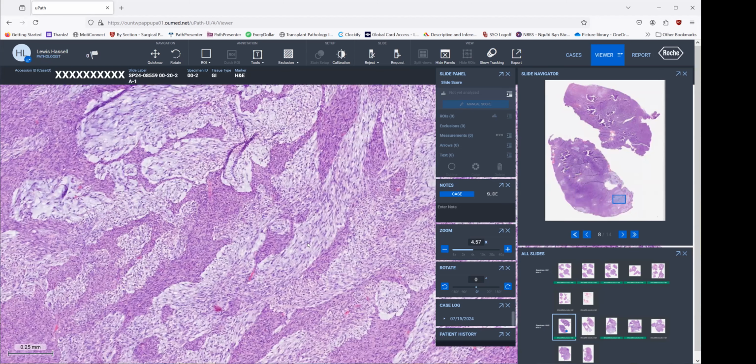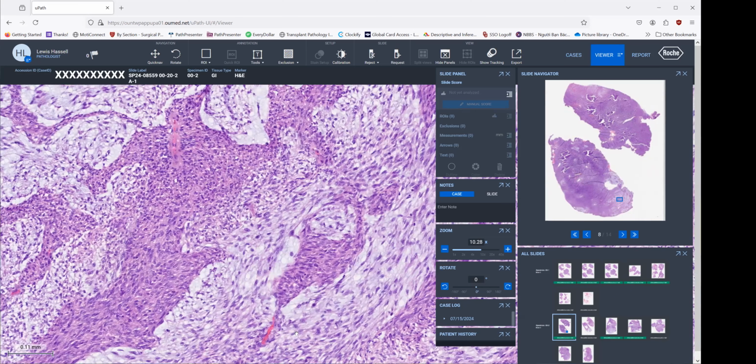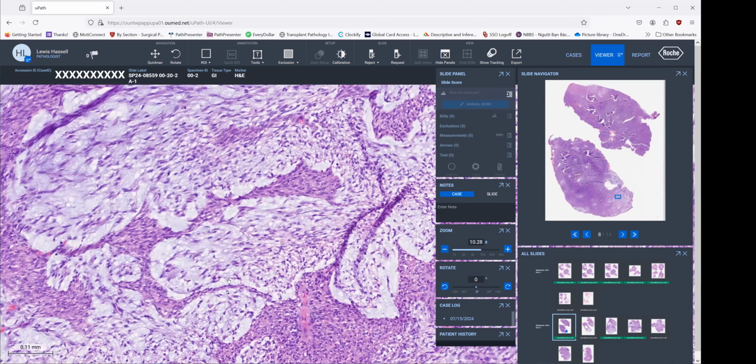If we got a tumor like this that had this sort of biphasic myxoid and solid areas, and it was just listed as a soft tissue tumor, we might be considering things like synovial sarcoma, or we might be thinking about things like maybe a myxoid leiomyosarcoma or something of that sort, or maybe if it was a woman, an endometrial stromal sarcoma of high grade. But this is just the appearance of a post-treatment non-responding GI stromal tumor.